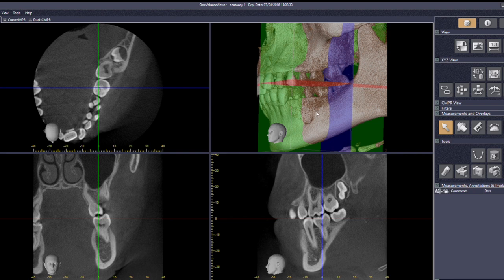Okay, that was the first tutorial about how to use the basic software. I'm going to start again on the next tutorial with how to line things up. Okay, the next stage, the next skill we're going to learn is about lining up the arch. So what I mean by that is none of these coloured lines actually correspond to any of the arch lines.